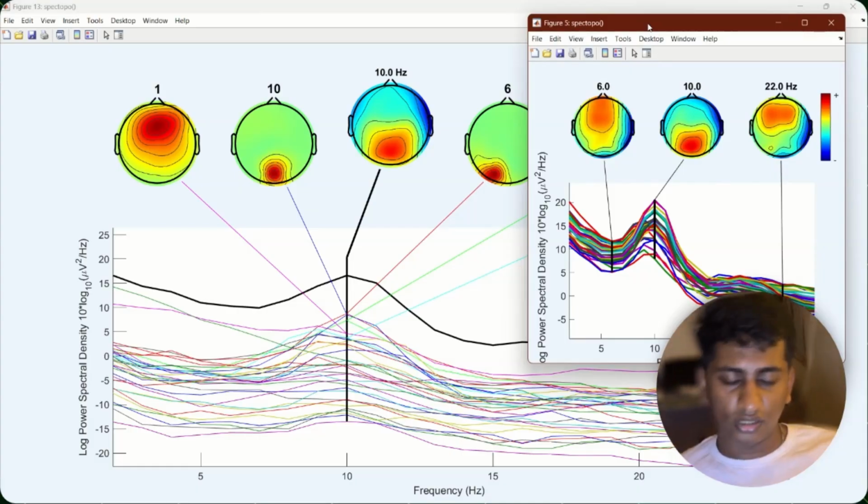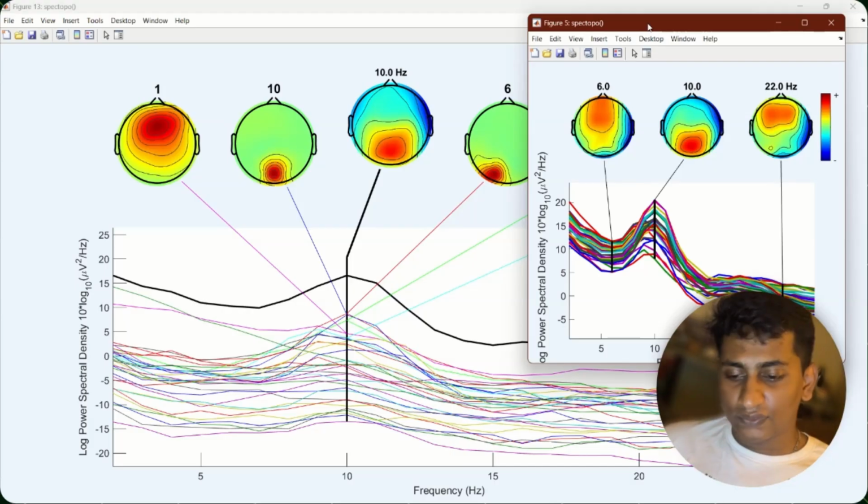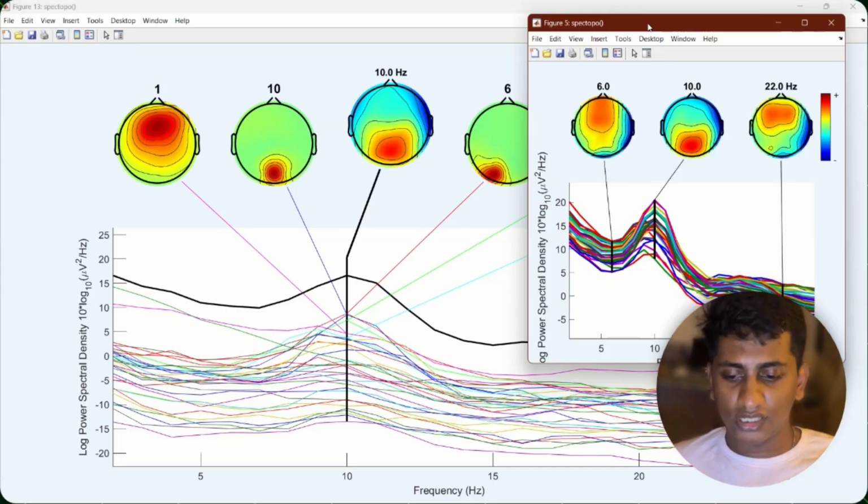Yes, this is correct. So I think now you get an idea of how we are splitting each and every data point so that we can segregate everything. So basically, remove the components, clear the artifacts, one to two blink components or something, then reconstruct the clean data. Then the IC components of the scalp are highlighted, like the blinking component, before and after the ERP, showing the artifact removal and all.